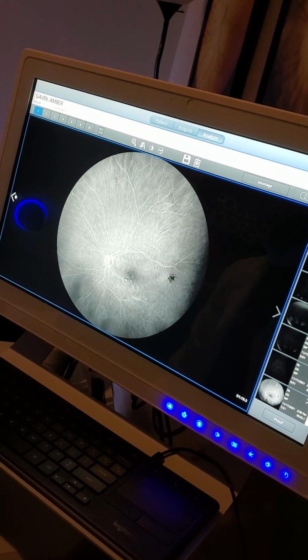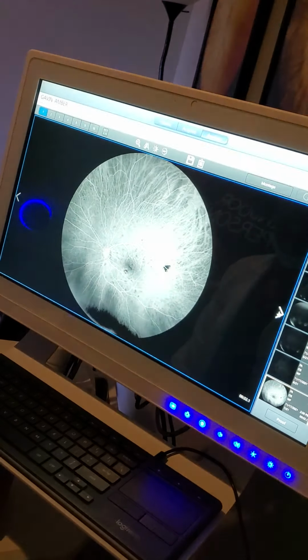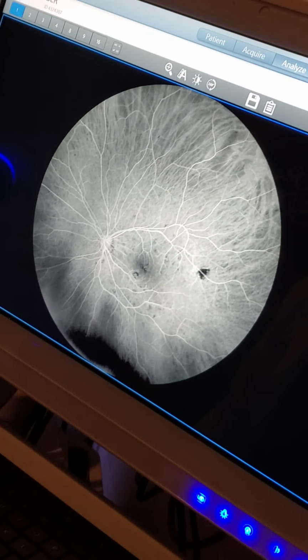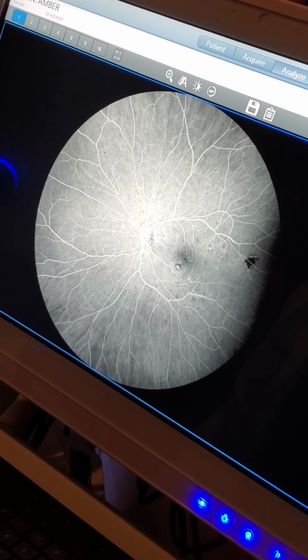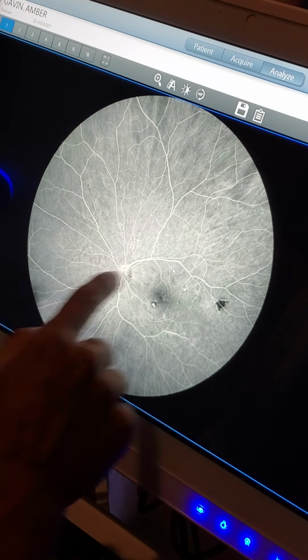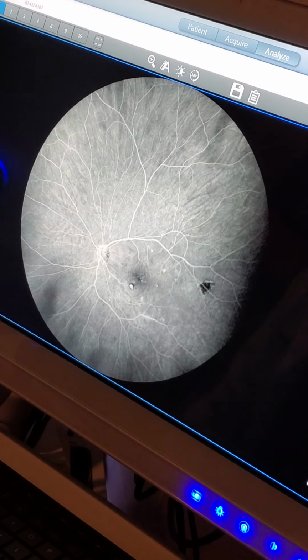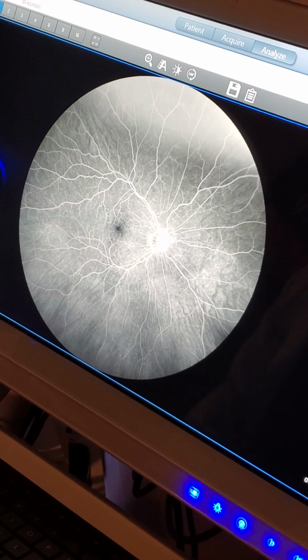So let's walk through from the start here. Here's essentially the start of the dye test. When I'm looking through the dye test, as time goes on, usually if the lesions are active, these little white spots will start brightening up and getting brighter and bigger, if you will. They look exactly the same.